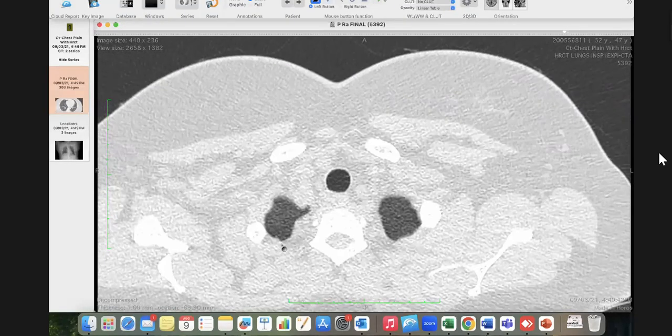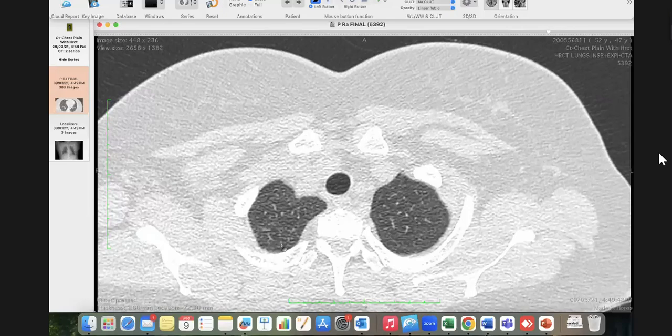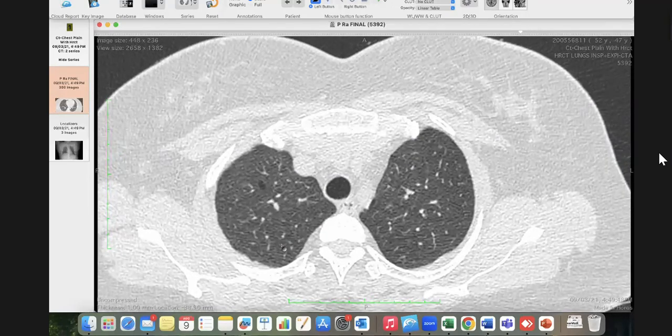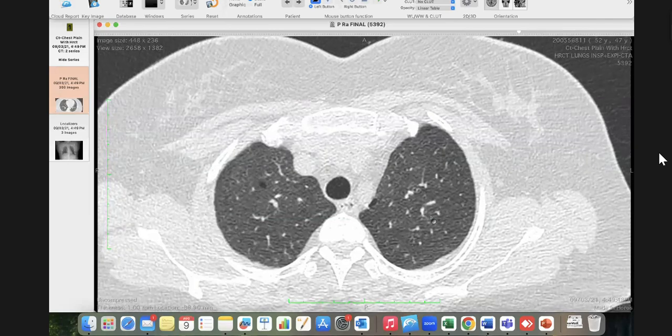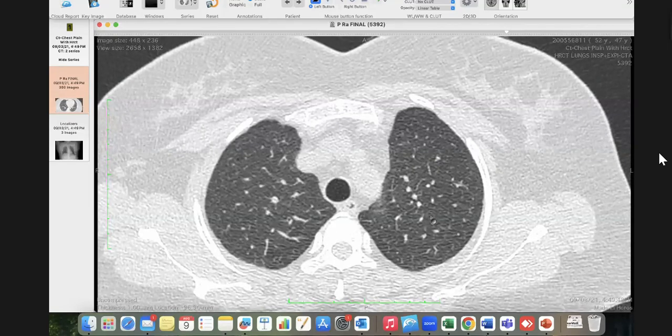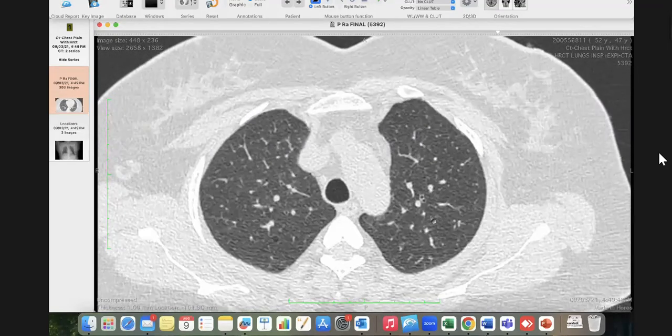Top to bottom. Now look at the trachea and look at the lungs. You would see that there is some kind of haziness in the lungs as compared to the attenuation inside the trachea. So this is like air, but this is not really air. There is a subtle ground glassing. That is what I have made up my mind.